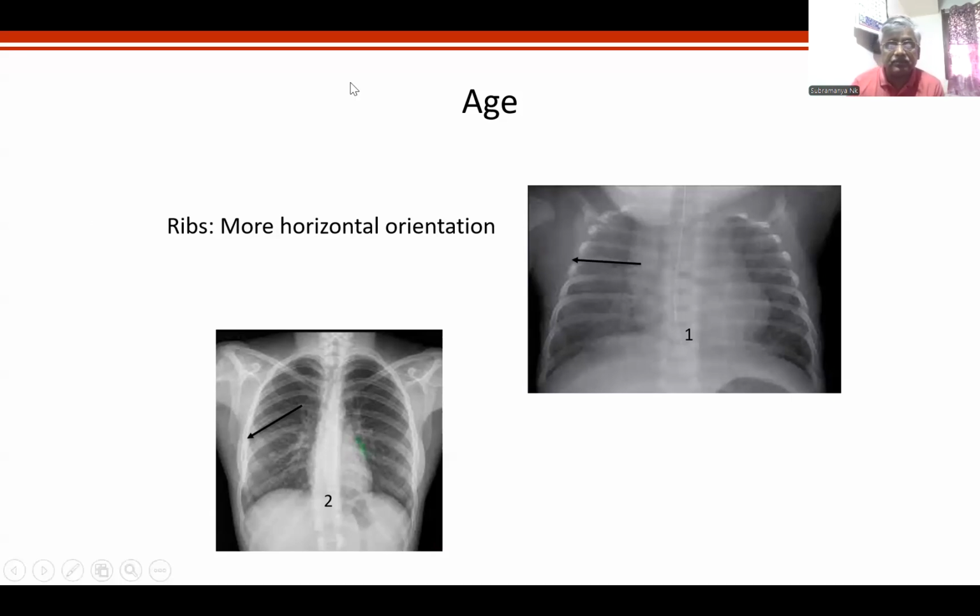That means to say, whenever the ribs or any of the structures overlap, it is not necessarily a rib. I'll give another example of overlap of a clavicle with a rib, or of the cardia with the rib and the lung. Can you see here? Here the ribs appear less osteoporotic, I would use the word. Less osteoporotic means the ribs appear more dense around the cardia, but they are not dense. This is an apparent feeling.